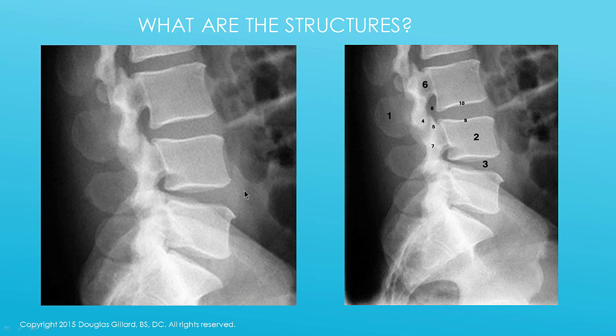Anybody notice anything weird here? This patient has, see, this disc space is a little thinner, isn't it? That thinning of the disc space is pretty strongly associated with chronic low back pain. So we'll talk about that in differential diagnosis, in the lumbar spine when you get up to 8th quarter. All right, let's see if we got them all.